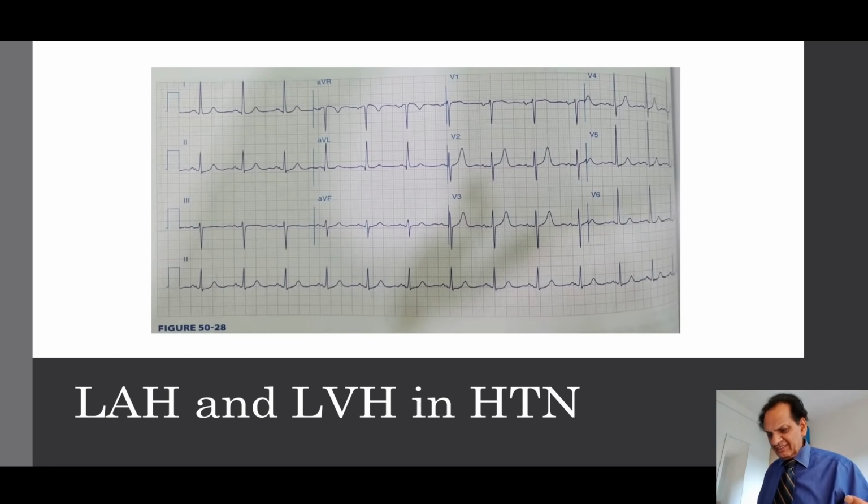In hypertension cases, see the LA. This is LA enlargement with the more negative segment of the P in V1. Very suggestive of left atrial enlargement. Left ventricular enlargement by voltage criteria is very nicely shown here.